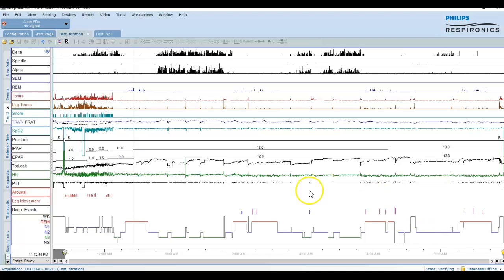So in this patient study, you can see that it's well controlled with a CPAP of 13. Now, if you apply the type of the titration, is it optimal, good, adequate, or inadequate? You can see that the patient had supine REM sleep, uninterrupted REM sleep, and REM sleep is almost 30 to 40 percent of the time as well.